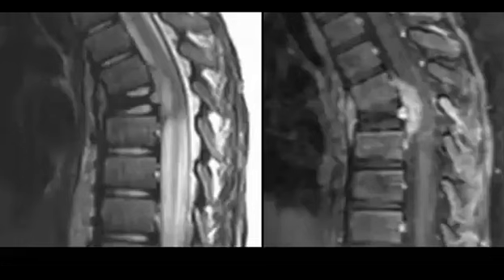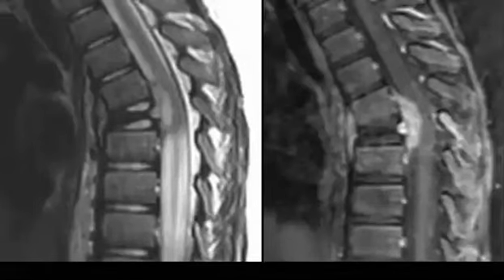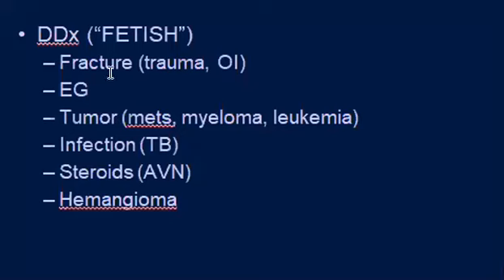Again and again, vertebra plana in pediatric is one of the important differential diagnoses when you find it. And probably they like to show you sometimes the MRI, especially after you describe it. Nice. Langerhans, don't forget. I think you will remember lymphoma and leukemia and maybe infection, but don't forget Langerhans. This patient has an epidural soft tissue component. So we mentioned this many times.